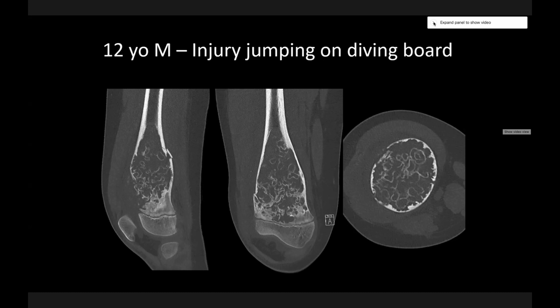Right. I think so. When I look at this, and I have no clue what this is, but that pattern of calcification, almost serpiginous, almost arcs and whorls, tells me that there's some kind of a chondroid matrix involved, maybe, in this lesion. But that ground glass throws me off a little bit. Could this be a weird case of fibrous dysplasia? It's localized to the metaphysis.